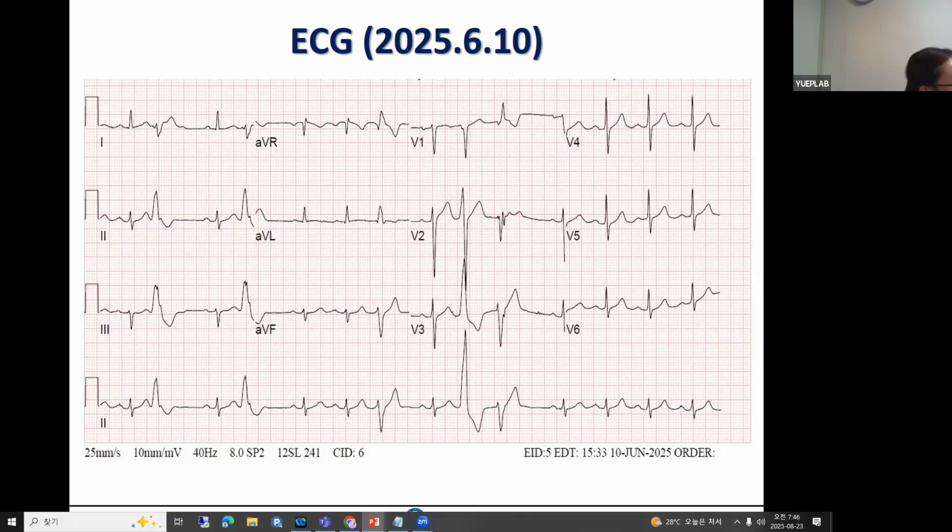So this one, what we saw before, right? And then you got a coupling closer, this one. But make sure that there's no P wave conduction here before you interpret that it's associated there. Okay. So now, one is the left bundle, one is the right bundle, right? That's what you're trying to refer to.